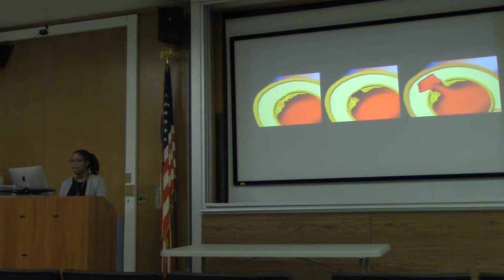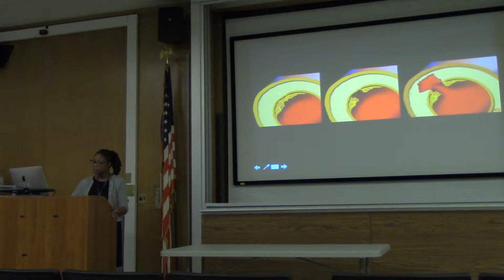Very good. So let's talk a little bit about the penetrating aortic ulcer. This is something that is a consequence of severe atherosclerosis and disease in the intima. These patients tend to be older and have a lot of plaque burden in the aorta. You can see here that there's an atherosclerotic plaque that ulcerates and eventually erodes into the media. And then again, the same thing happens. You have pressurized blood that can enter the media and cause aneurysmal dilatation and cause a dissection and intramural hematoma.